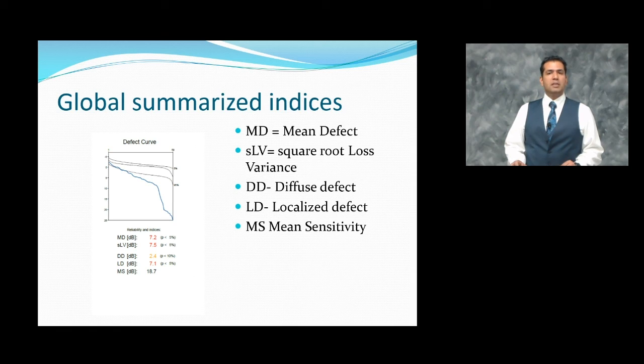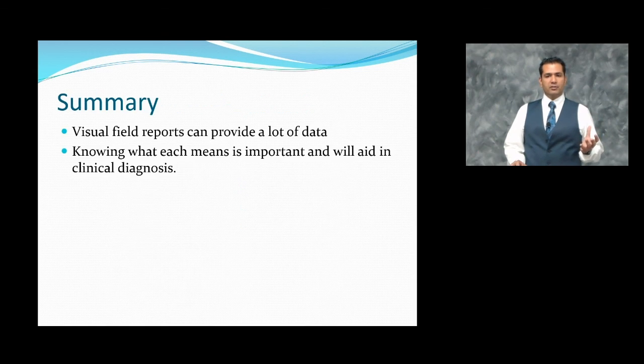MS represents the mean sensitivity, that is, how well the person sees in decibels in the overall visual field. Visual field reports can provide a lot of data, but knowing what each of these data points means can be very important, make things less overwhelming, and will aid your clinical diagnosis.